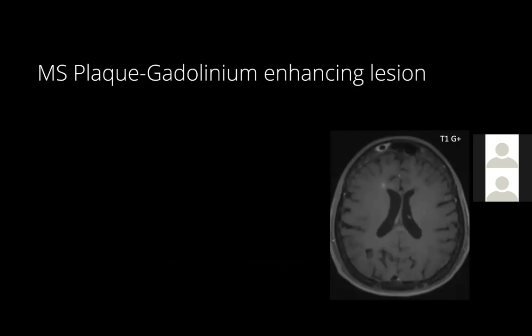And the other lesion is the gadolinium enhancing lesion, which is also seen on post-contrast T1-weighted images. Their time duration is usually 3 weeks to 3 months. If they are seen beyond 3 months, then we should think about other differentials. And these are due to blood-brain barrier breakdown, so that the gadolinium can cross the interstitium and go into the CNS.